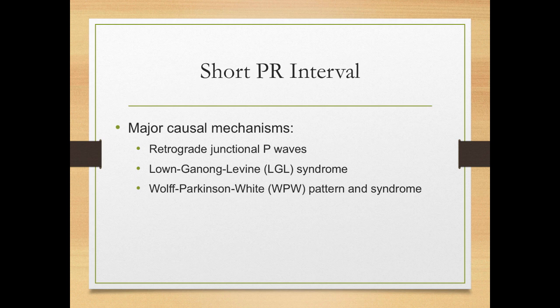and these pre-excitation syndromes. But if we've got a short PR interval, we're thinking something's going on, something weird's going on. So it's not just a sinus rhythm or normal sinus rhythm. Maybe it's junctional, or maybe it's one of these pre-excitation syndromes.